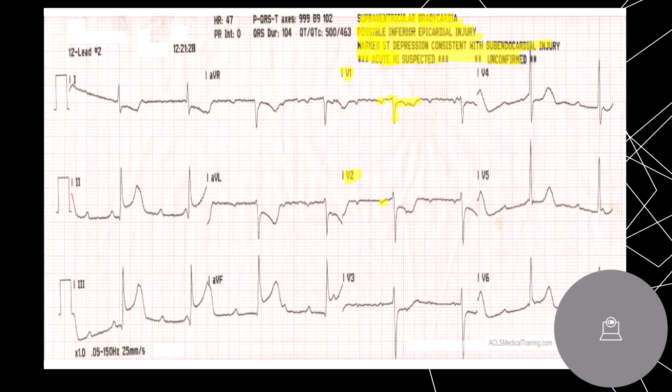Look at V2. That's a P. This is QRS, right? And this is your T wave, right? So highlight this, and we can break this apart. This is termination of the QRS, baseline. So again, V2 is depressed. V1 is depressed too, because your J point is somewhere in here. So it's a little depressed in there. V2 is definitely depressed.